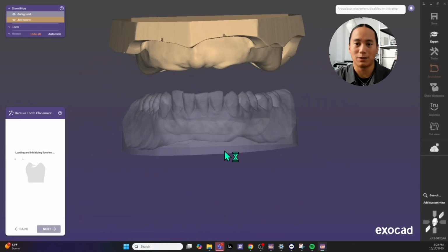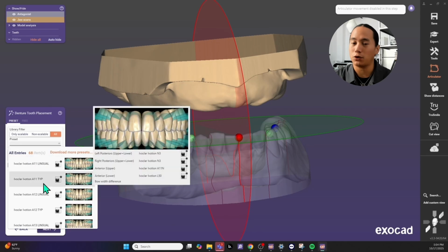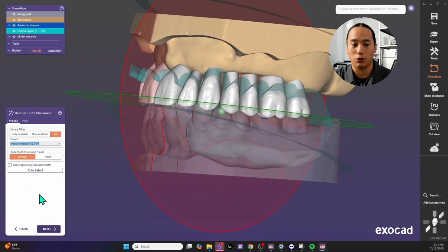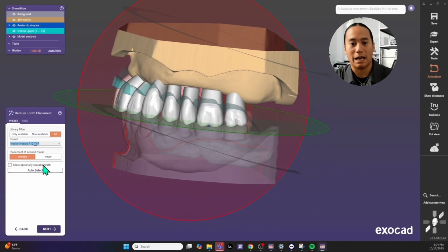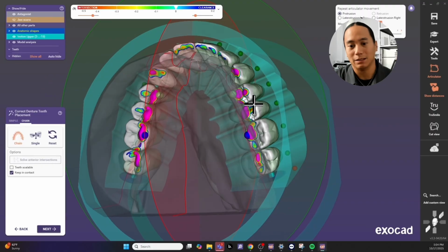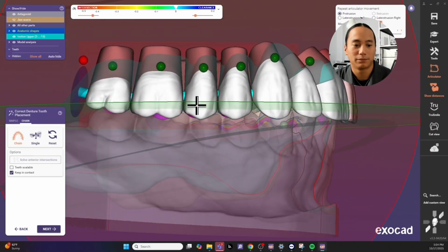You have to have specific libraries, and the Denture Ivotion Module comes included with the purchase of the Denture module. So when you choose the Ivotion Ivoclar teeth, you're going to see their signature blue wave that signifies the position of each tooth. We don't want to deviate from that, because then the teeth will bleed into the gingiva area and vice versa.